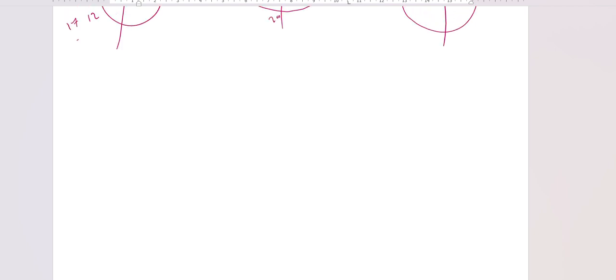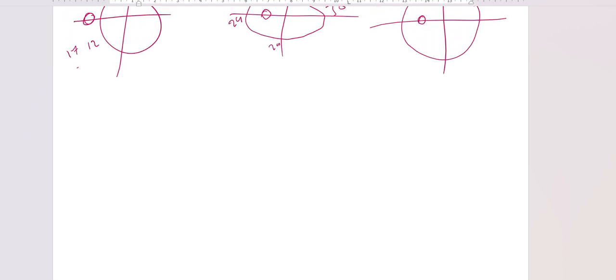As we discussed earlier, just a recap: the optic nerve lesions are strictly horizontal, respecting the horizontal meridian. Glaucoma, for example, respects the horizontal meridian. That's why we have the nasal step, and we have the temporal wedge.